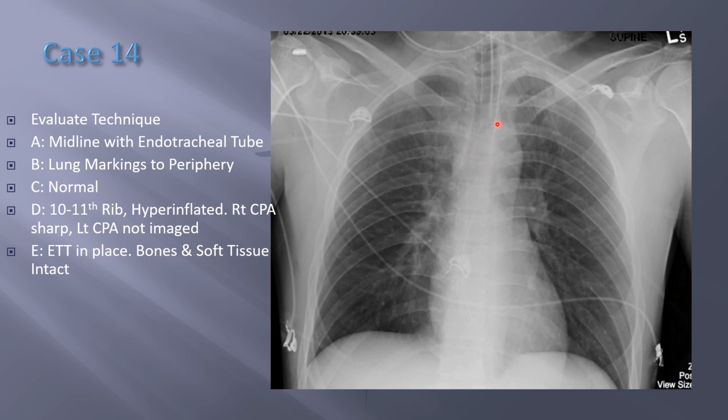Okay, we see a gastric tube going down here. Can't see where it ends up, but it's probably some sort of gastric tube there. And we got our EKG clips on, and this is just a button from their gown. So this endotracheal tube is maybe slightly high. I have to measure this, maybe come down a little bit. It's just slightly high. I would advance.